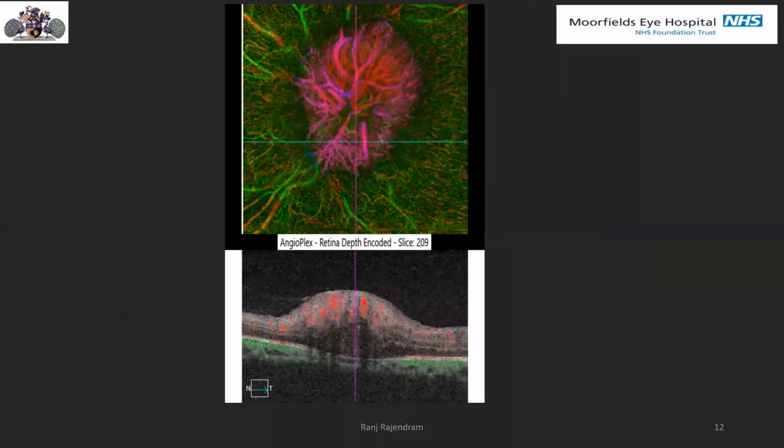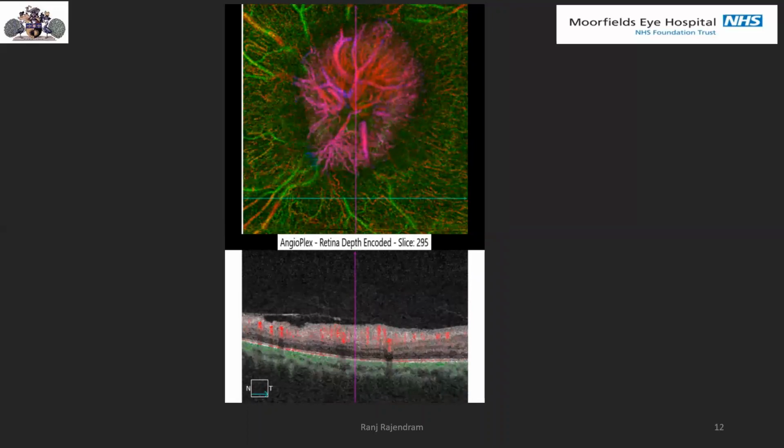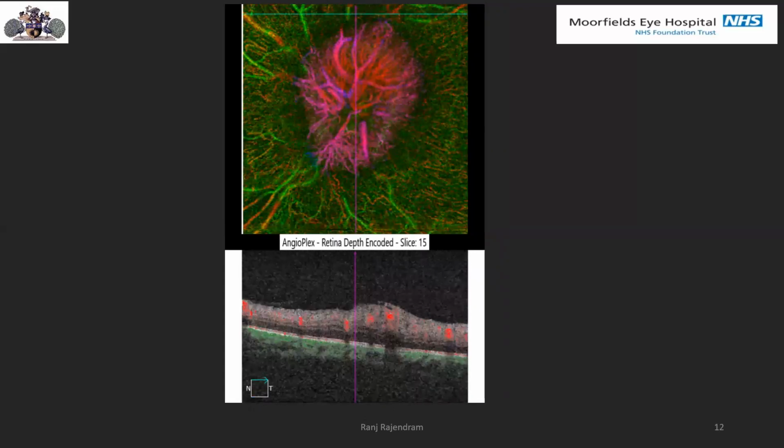You can see them with the flow. And then there's a neovascular membrane coming down. So, this is really important to document because we need to start treatment for this patient. It can happen in some of these patients that they're asymptomatic until they have an event. So we really need to show them what their image is and document that before we start treatment and then as we go along. New vessels elsewhere.